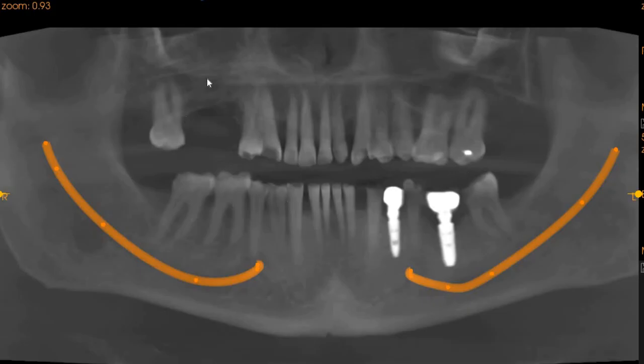On the panoramic view, we can see the upper right region is edentulous. We've got a radiolucency associated with the lower right first premolar. We've got implant placement, which seems to be appropriate. Moving to the transaxial view on the upper right second premolar region.